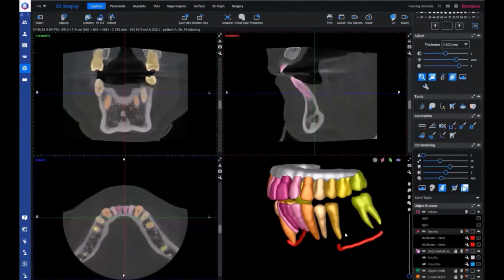I wonder, do you see now anything from my screen? But you can 3D print these models. So you can 3D print all the teeth as separate, smaller files, or you can 3D print, for example, here I have 3D printed the maxilla so that all the teeth are fixed here. So it is up to you then, depending on the case and on the need that you might have, whether you want to have it 3D printed for, again, explaining better to the patient, or doing a better treatment plan yourself, maybe for some complicated case.